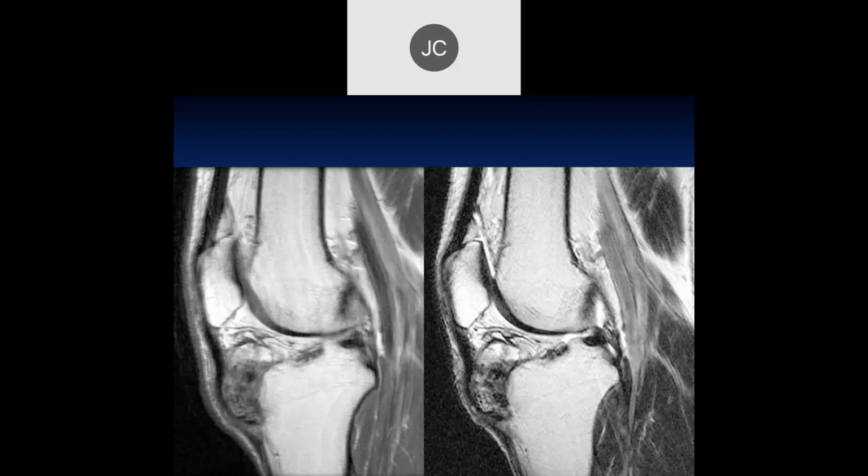Doesn't look like bone. Just looks like fibrous tissue. So maybe this is another chronic phase. Instead of getting bone displacements here with fractures, what you can get is just hypertrophic bone formation here. And if you continue to injure it, you continue to have a healing response, which is more granulation tissue rather than edema or fat. So this is another old Osgood-Schlatter disease.